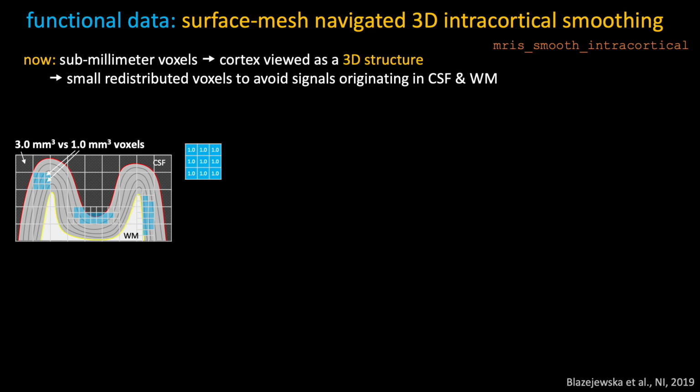So we can take whatever would normally fall into one big voxel and would be averaged with the same weight, and redistribute that and create a kernel which not only will have a shape that we desire, but we can also introduce weights and modify the contribution of different small voxels to this kernel.